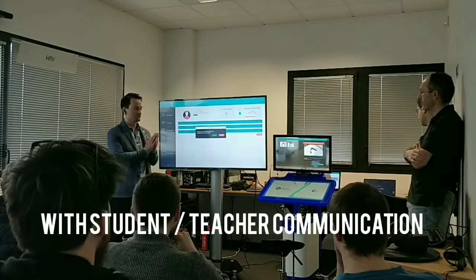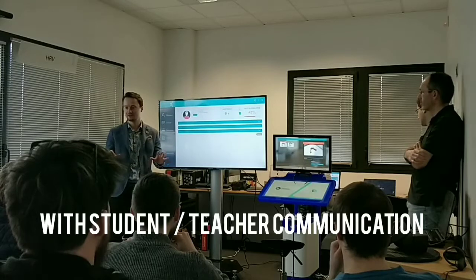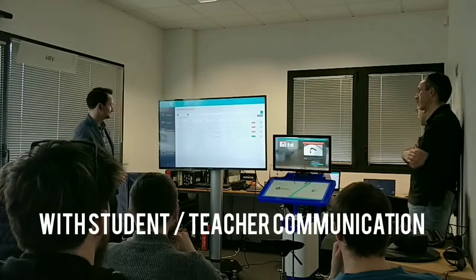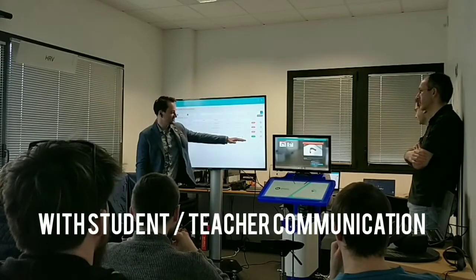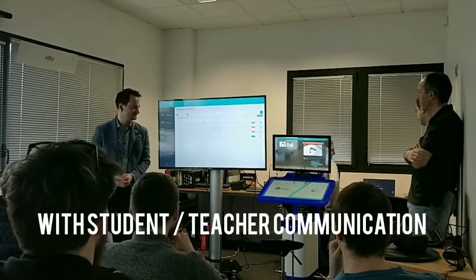So this will send all the comments to the student and it will make it read-only, so it's no longer modifiable for the end of the year report. Fantastic. And we can see here that as a teacher, our list has been updated so we can see which evaluations we still need to look at.